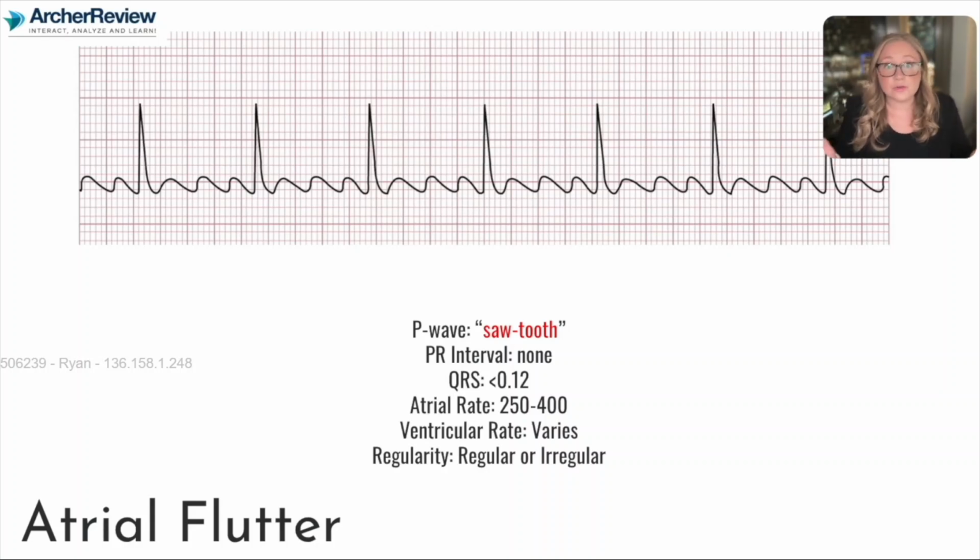So the ventricles are still working here, and that's great. That means we're still going to have some cardiac output since the ventricles are contracting and sending that blood forward to my organs. As I continue going through my checklist, now I'm going to check out the heart rate. This is super hard to evaluate because before I had a P wave, a QRS, and I could easily just count those QRS complexes to see how many times the heart was beating. Well, not so easy anymore since my atria are going haywire.